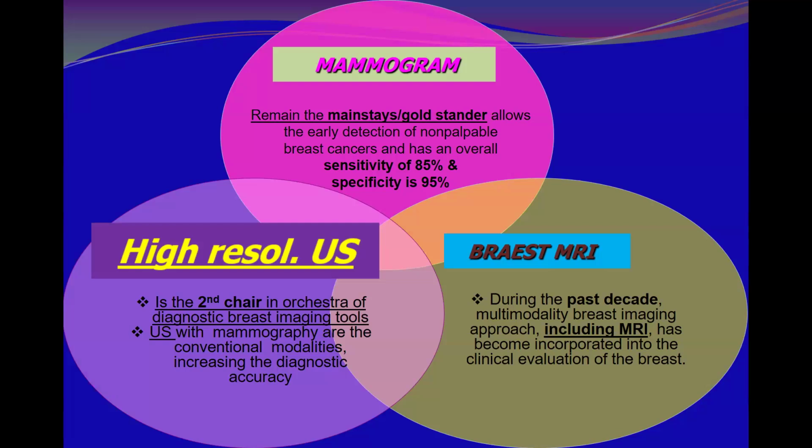As you know, mammogram is the mainstay, and high resolution ultrasound is a second chair in the orchestra of diagnostic breast imaging tools. Along with mammography, they are the conventional modalities increasing the diagnostic accuracy and also now playing a role in screening.